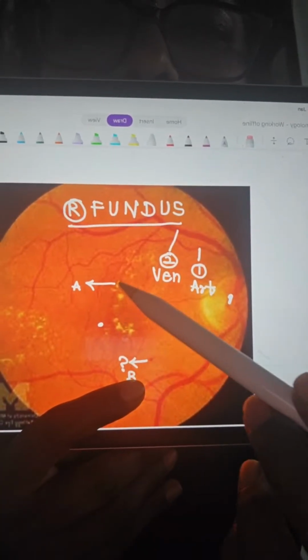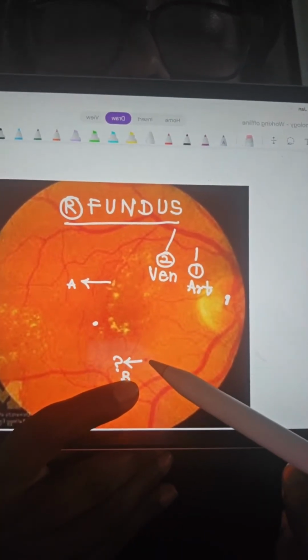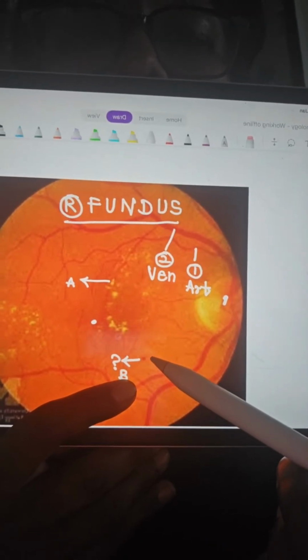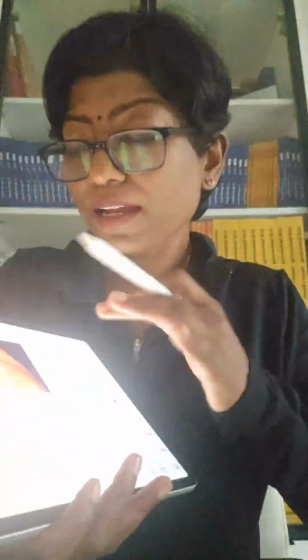That's a retinal hemorrhage. It's a little big hemorrhage, or you can even say it's probably a microaneurysm. We really don't know. A microaneurysm and a dot blot hemorrhage. Dot blot would be a little more blotchy. One second.